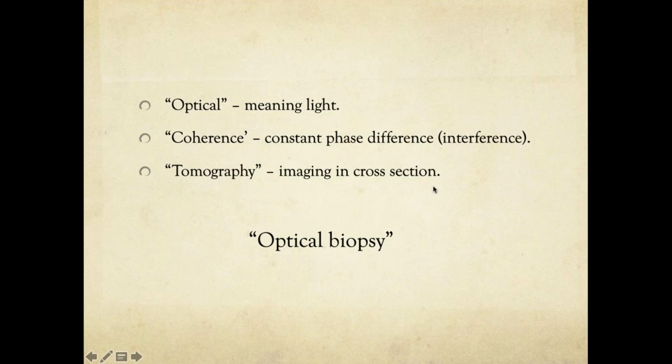Why I am focusing more and more on the optical biopsy theory is that if you know all the layers of the retina, that is your histology. And what you see in the OCT is basically the same thing. So when you know all the layers, and for example, in the macula, the layers that are devoid, what happens is you start knowing about your connections.